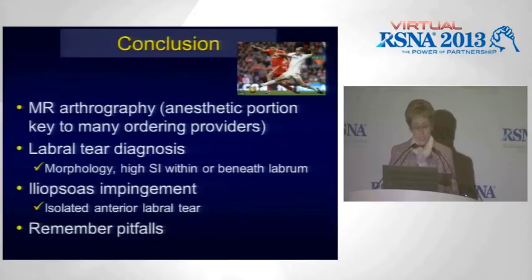Also keep in mind with iliopsoas impingement, that is when you're going to see those far anterior labral tears, typically at the 3 o'clock position, something that we may want to suggest ahead of time. And then also just remember the pitfalls.